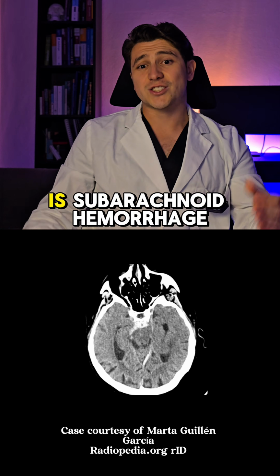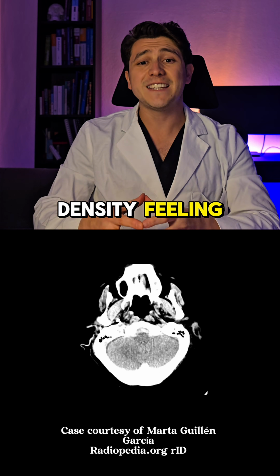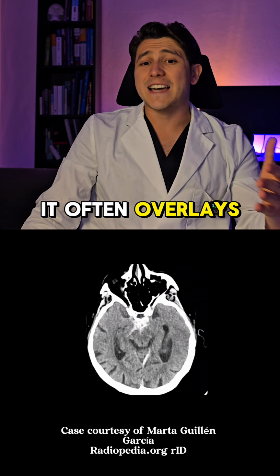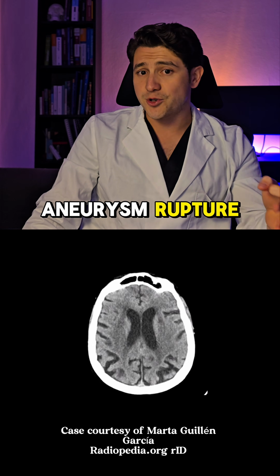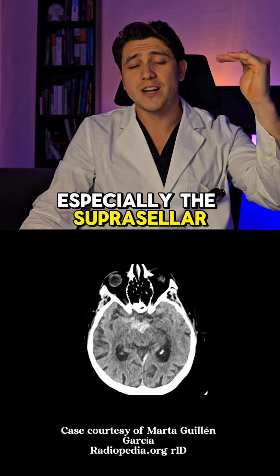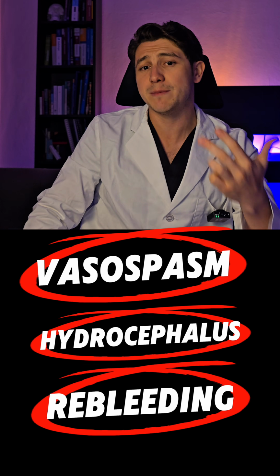The fourth one is subarachnoid hemorrhage. On CT, you'll see bright hyperdensity filling the sulci, cisterns, and fissures. In trauma, it often overlies the convexities. In aneurysm rupture, it centers around the basal cisterns, especially the suprasellar and the sylvian fissures. The main complications are vasospasm, hydrocephalus, and rebleeding.